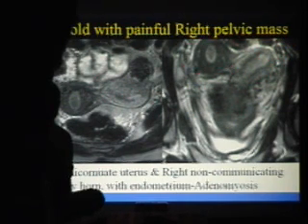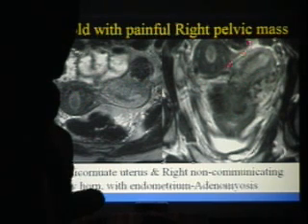We have another system over here which is suspended off the side of the body of this uterus. It was isolated. It did not communicate with anything. Multiple images failed to reveal a cervix or a vagina attached to that. And so as you can see from the answer down here, this represents the rudimentary horn of a unicornuate system with a non-communicating rudimentary horn, no endometrial communication, but she does have endometrial cavity within that, and she does therefore have, as it turns out, adenomyosis in this rudimentary horn, and that's why she had such pain, of course, with menses.